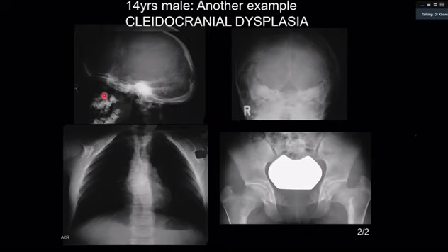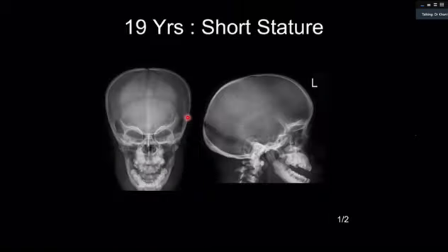If you see the maxilla, it is small, but the mandible is normal. And there is an angle of the mandible. So this is the main difference. And there is another difference which I'm going to highlight. So now, candidate 13, if you can tackle this film.